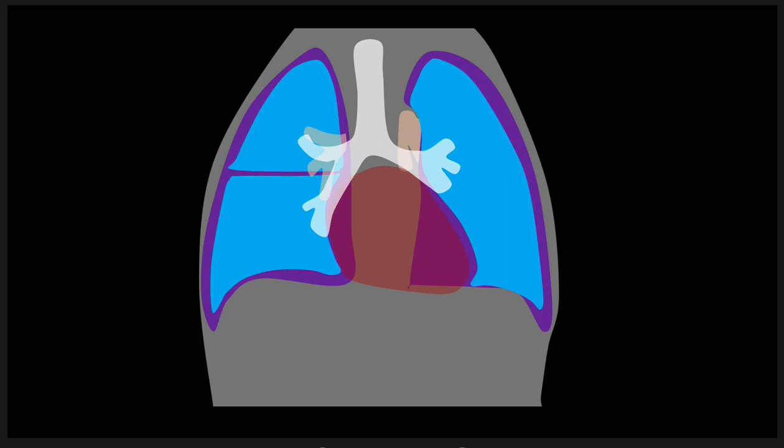The most common or classic appearance of a pleural effusion is an opaque meniscus right at the costophrenic angle. An important thing to remember is that you need about 200 or 300 cc's of pleural fluid to be able to make this appearance on the frontal view.